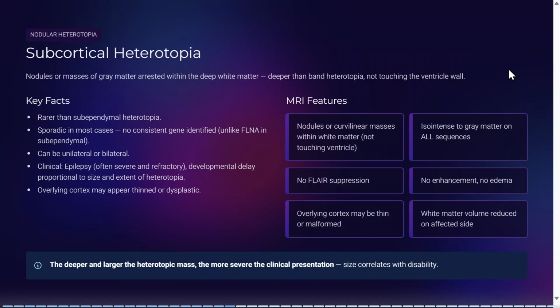The deeper and larger the heterotopic mass, the more severe the clinical presentation will be. Size correlates with disability. So it is important to know that symptoms can guide you to the severity of the disease in heterotopias. Now, we have another image.